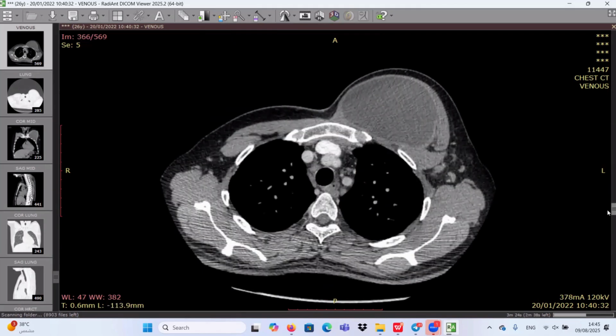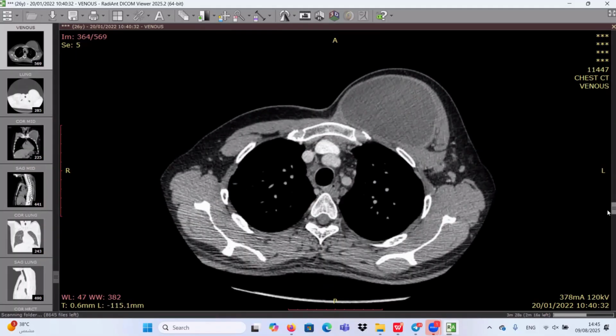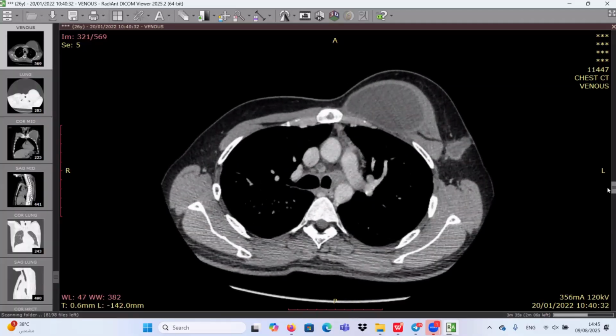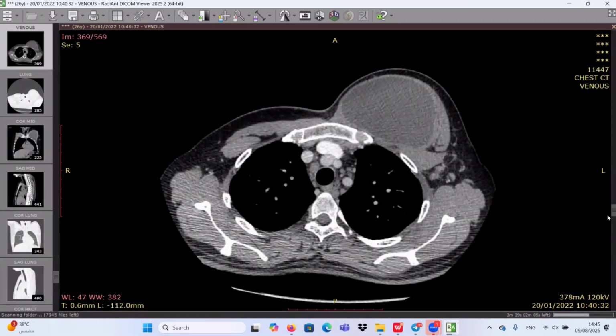internal necrotic areas in the axillary and retroperitoneal region. There are multiple retroperitoneal nodes as well, which I could see in the lower, like upper abdominal sections. So we have here a large cystic lesion in the left anterior chest, insinuated between the pectoralis major and pectoralis minor muscle. I think it is an intermuscular location, and this one is, I think, unilocular.